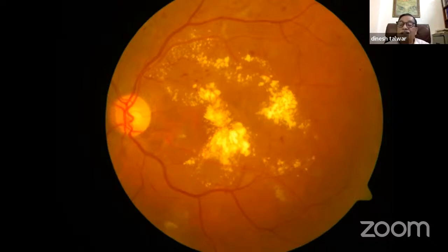One is centered on the disc. You're talking about one is centered on the fovea, and one is centered on the edge of the fovea. Yeah. So that is in the center, isn't it? So all those are actually within the central retina only. So the 4 quadrants would mean these 4 quadrants.